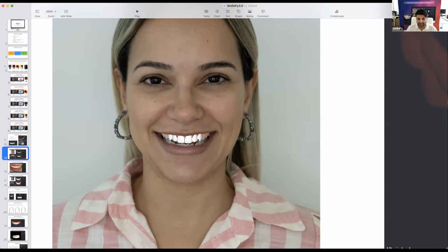The results are really special, not only because we can now adjust the gingival margins, but because we can also redesign the nature of the tooth: open embrasures, close embrasures, change the form of the tooth from round to triangular, not destroying the morphology and keeping the same quality.